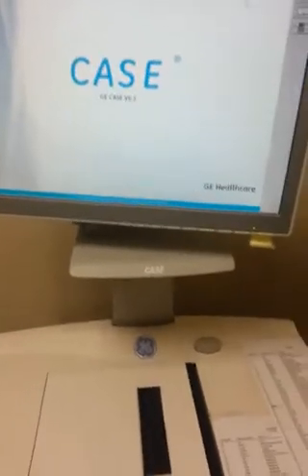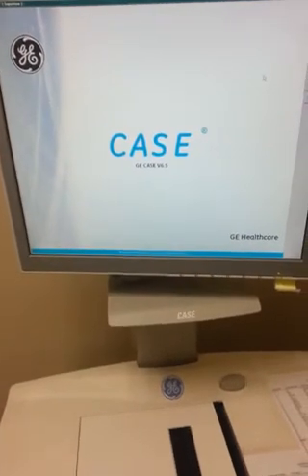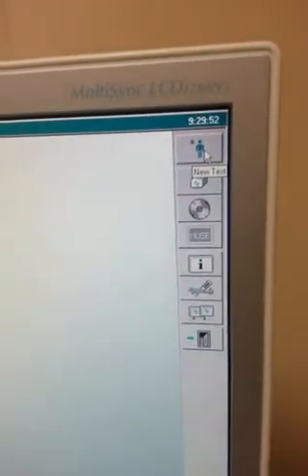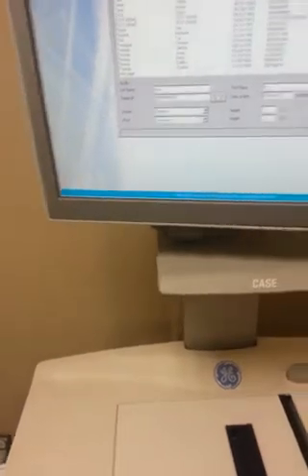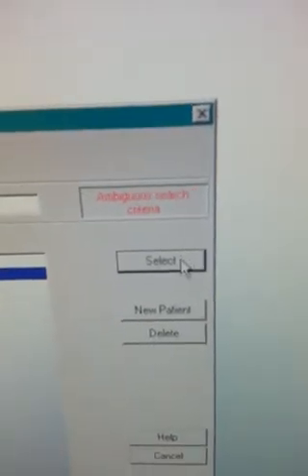This is part 3. Part 3 is going to discuss the treadmill, Cardiolite, or the treadmill. Basically, you do the same setup. So you come up here, remember to click on this, or you can click down here on this button right here for a new test. You remember the previous selection process. I'm just going to put test. So I've got test, and then I hit select.